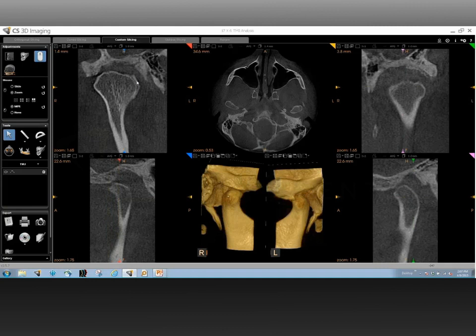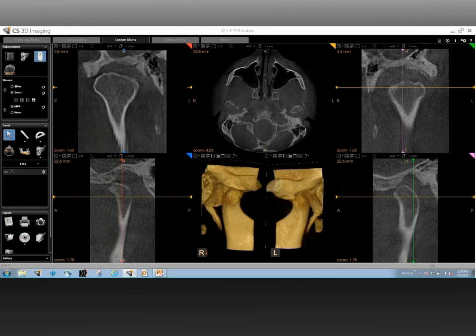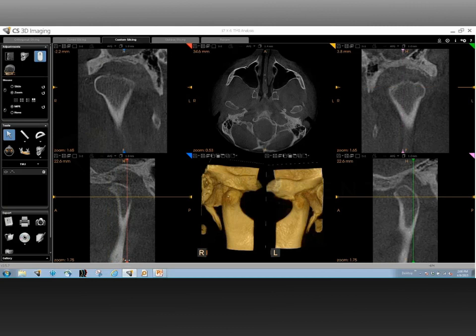You also see some sort of remodeling that's happening on the medial pole, which again indicates osteoarthritic changes. In fact, it's not really smooth and rounded, as I had mentioned earlier. There's a little bit of a corrugated appearance, maybe a little bit of break in the cortical areas right there I'm pointing to, again indicating degenerative disease or bone remodeling. And then I probably would stop over there and show you that there's a remarkable loss of the cortical bone on the superior head of the condyle right there as we go further back posterior.